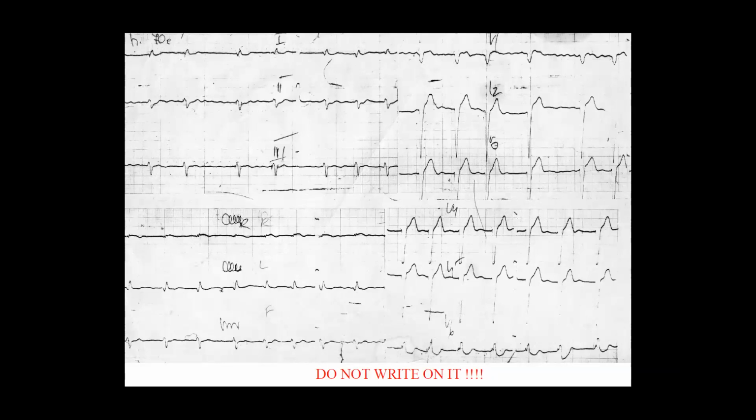Will the midterm be like this? Like we will get just a random one? Yeah, you will get a random one, but it's common to everybody. So I'm using the official ECG, so it won't be a difficult one. Believe me, these ECGs are more difficult. It's a good practice, picking up an ECG and having no time to be prepared. Of course, you will have time, but maybe 5 or 10 minutes, and you have to present it. But this is how the clinician should work. When you get the ECG, you have to evaluate it immediately.